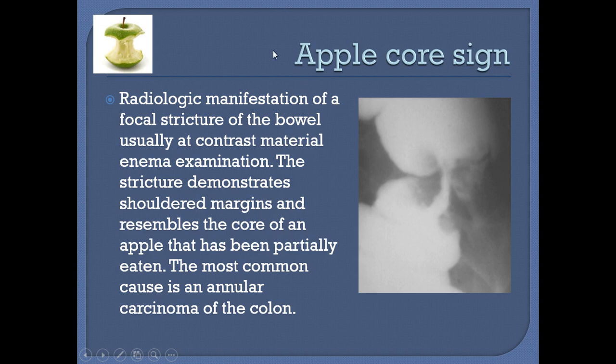Then we can also have contrast studies in abdominal X-rays, and we can use two types of contrast medium. It can be barium or it can be gastrografin.